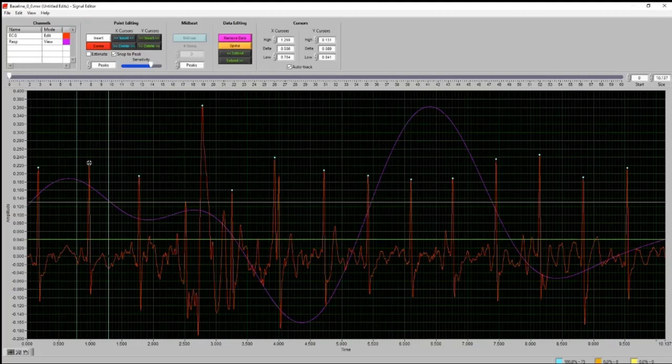In theory, though, or really in practice, we can pick any point on the ECG waveform and compare it to that same point on the next complex. So we're simply picking the R peak because in this case, in a lead-two configuration, it looks like this, and it's really easy to see where that beat occurred and compare it to the next beat and continue on. Anyways, the QRS point in this situation, and because of lead configuration, is very necessary. So we see those points there.